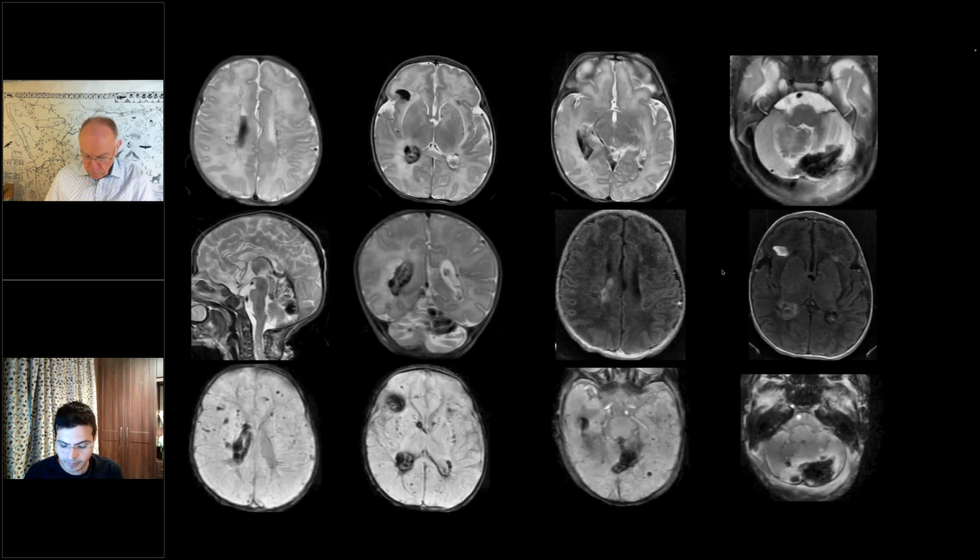Okay. Moving on to the MR. And on the MR, you have the T2-weighted sequences on top. And you have these areas of multifocal micro and macrohemorrhagic foci in the right frontal region, the bilateral basal ganglia. The choroid plexus also demonstrates hemorrhage, and it is slightly asymmetrical in comparison to the contralateral side. The hemorrhage extends up to the occipital horns on both sides.